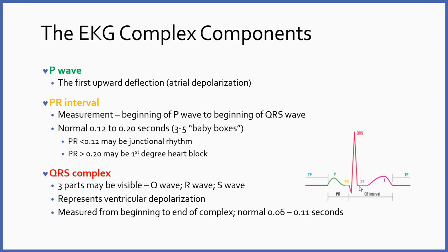All right, so our measurement of the QRS starts at the beginning. And so we have our P wave, and remember, this is just a little isoelectric time. The beginning of the QRS is where you see this change. You see the waveform, in this case, our Q wave starts to move down from baseline. So I start my QRS here and go across and find when it goes back, I end it here.